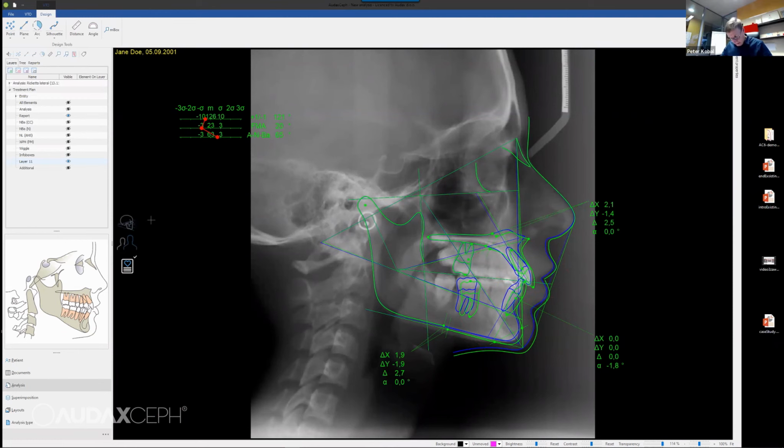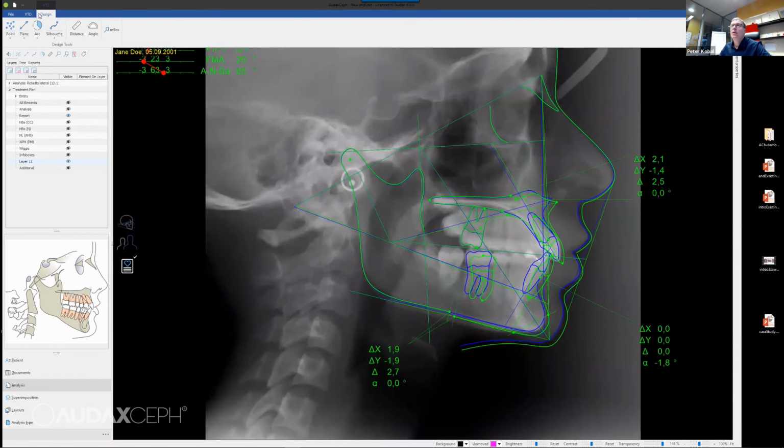I'm going now to show some things. We have here a possibility, for example, to add some elements, for example, a plane which is perpendicular to this one, and we can place it here. And if I want to move that teeth, I can move it simply by dragging it. So we have it in perpendicular direction to this plane. I move that manually around, so I can go here, but this is auxiliary geometry which helps me to place the tooth. We can move every teeth, we can do the rotation and so on.